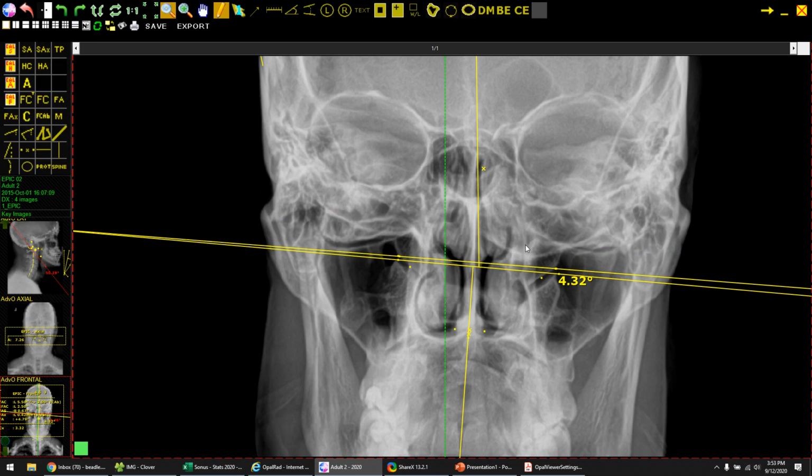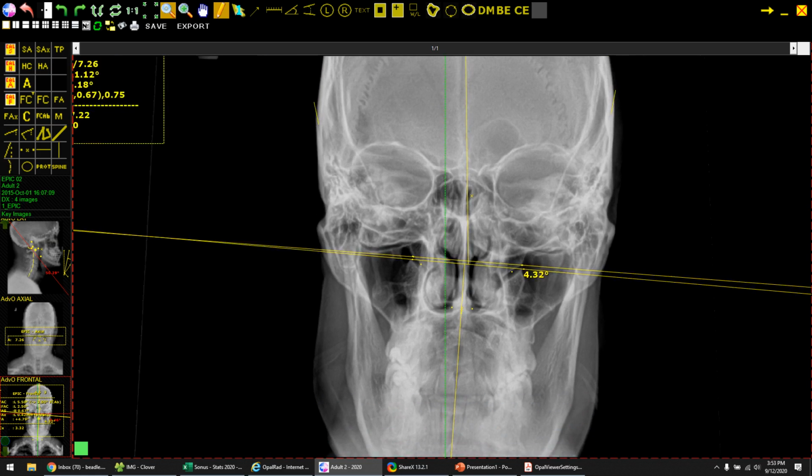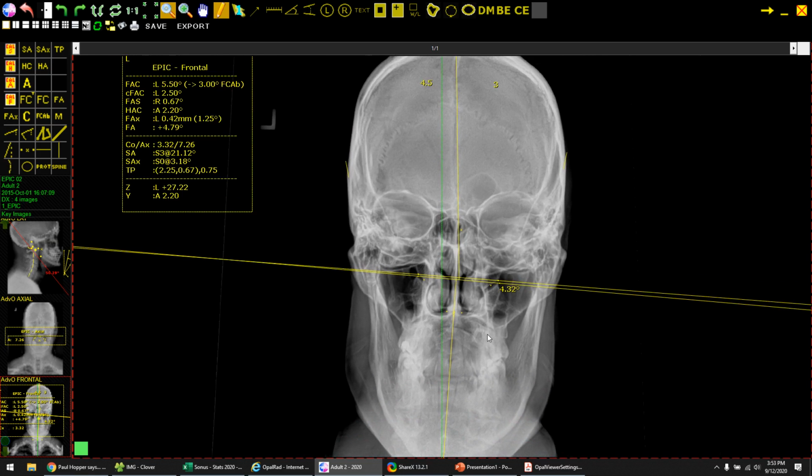One of the things that we'd like to see is that we would be able to see the internal condyles. So you have the outside condyle right here, but then it gets really, really difficult to see where that condyle ends, because again, that's where the foramen magnum is going to be. So that would be another great shot that we've been able to use with CBCT, to be able to see clearly, like with taking out the nose, taking out all those concha and everything, so you can actually visualize inside there. So those are some things that I'd like to see from just an upper cervical perspective.